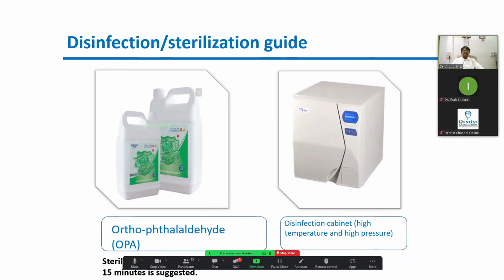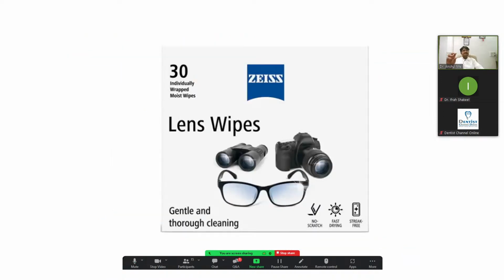And just the sterilization protocol, and this is one small tip. If you want to clean the tip of your scanner, use these wipes, so it will not leave any layer on the backside. For example, if you use spirit or isopropyl alcohol when you clean it, it will leave one layer on top of it, and it will blur your mirror. Say you are doing immediate loading and your blood gets onto the glass of your scanner as you scan; you clean it with this, and it will not leave anything on the backside. So this is what you can use for cleaning the tip of the scanner.